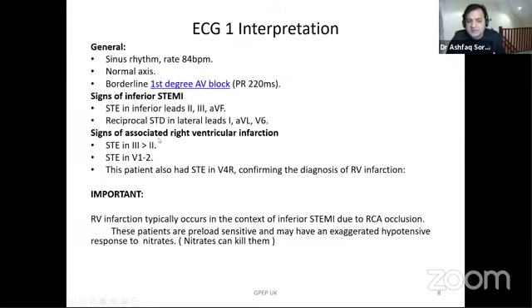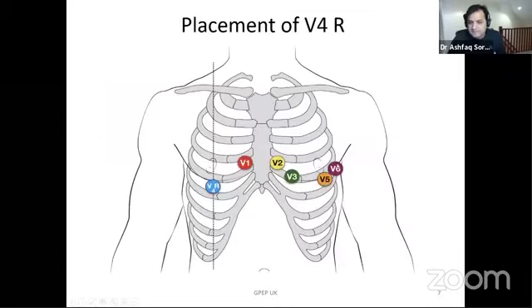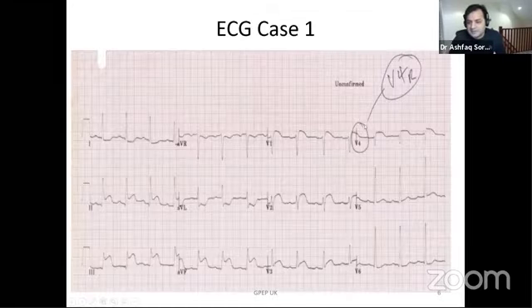This is important. Now, if you look at his V4R, which confirms the right ventricular infarction, you see that? Are you with me?